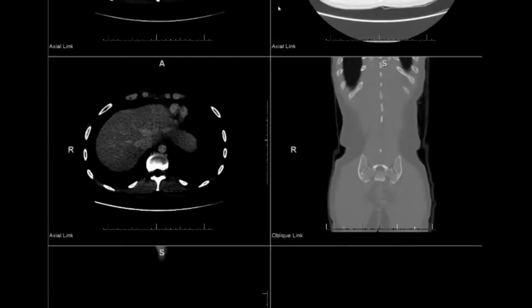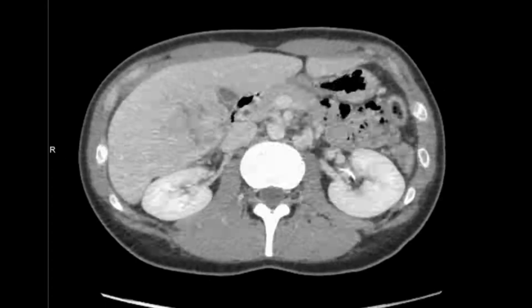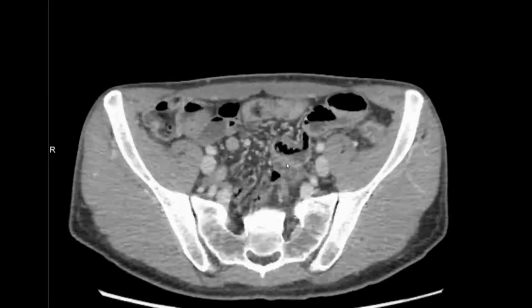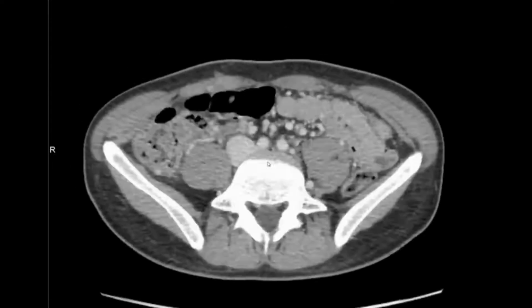And then the last rundown would be looking for any type of distal nodes that are basically not in the right upper quadrant. You think about retroperitoneal, maybe mesenteric, but nothing is coming through on this quick view, although it's kind of challenging with a person with very limited amount of mesenteric fat.